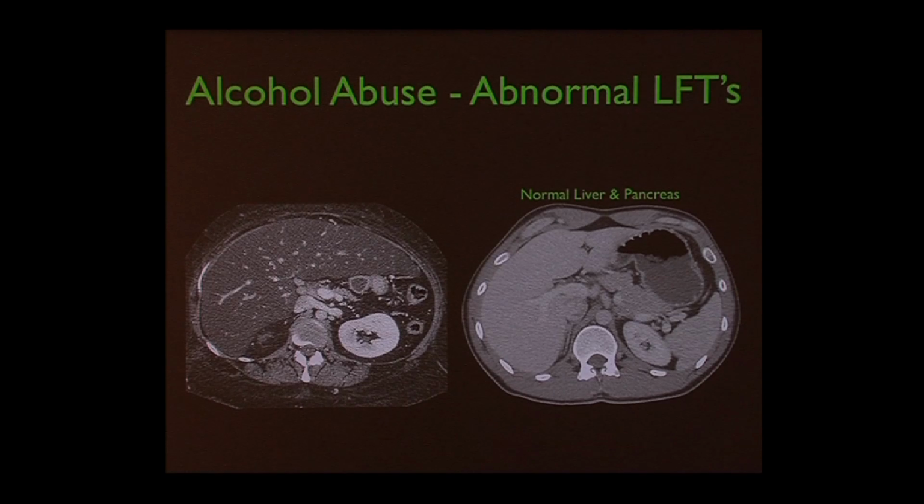Okay, here's another case. Alcohol abuse. This happens to people sometimes when they drink too much. And here's a normal liver.